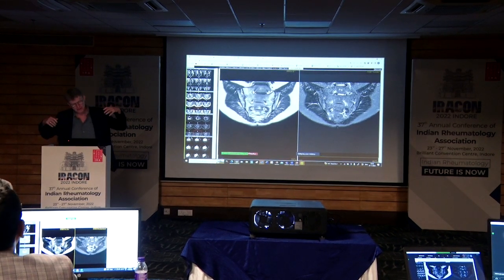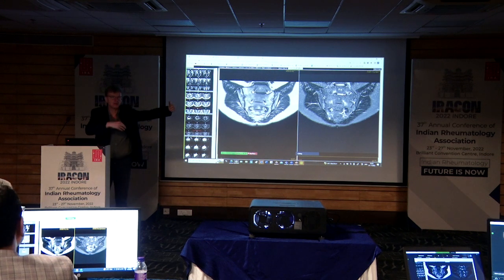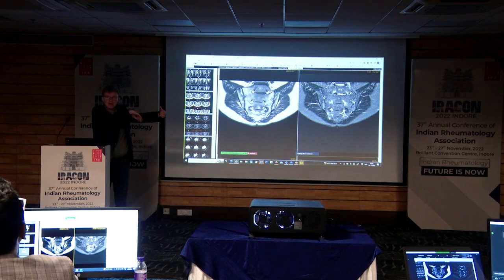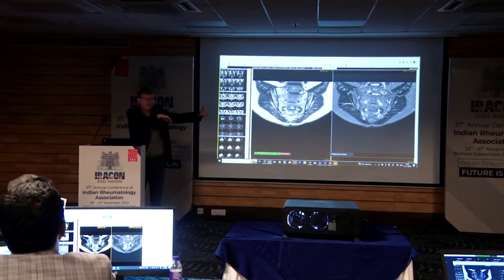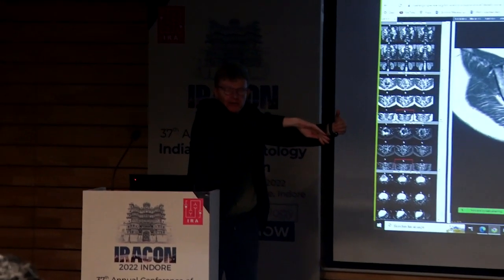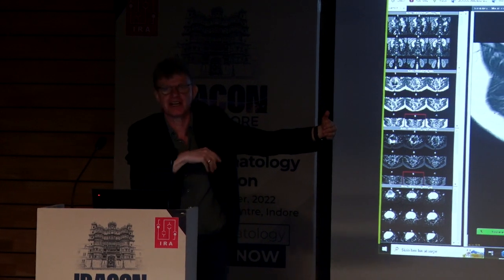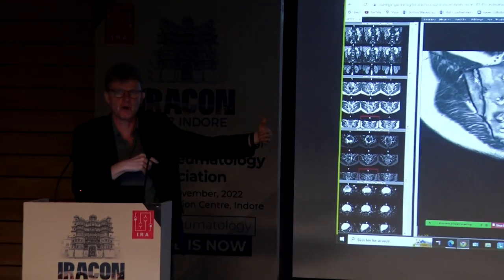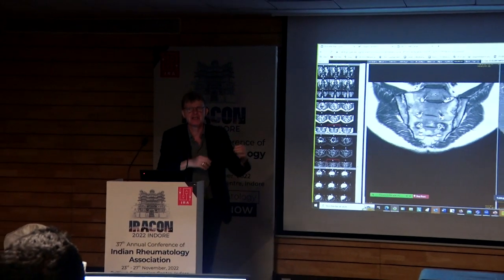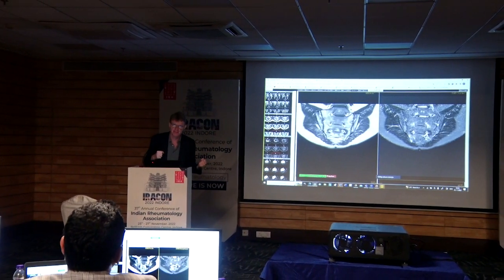I would say no, in principle not, because if you have a large cavity that you've been digging, eating out, and then you start filling out from the bottom, that's a backfill. And then it may not be totally straight. It may be that it does build in more here than there, and it takes a bit of time. So I wouldn't call those irregularities on top of the backfill erosions.